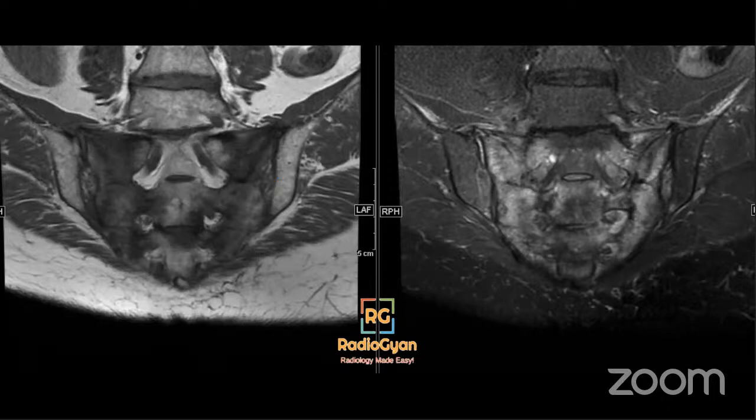Perfect. So all of you have pointed it out, right. Dr. Diaz mentions, could this be sacroiliitis? That's a good thought. But if you see, the pathology is centered more on the medial aspects of the sacrum rather than the joint. So the joint per se appears okay.